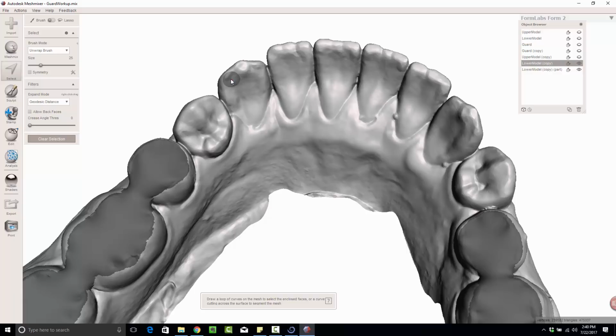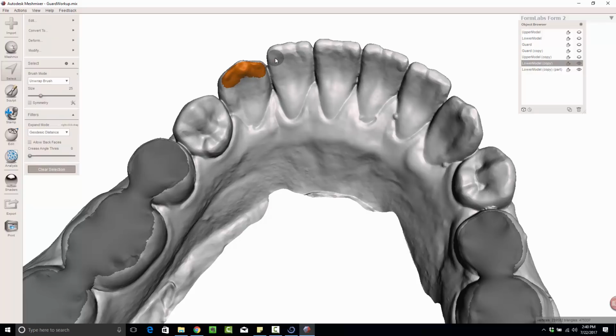It doesn't really matter. We're going to stay to the lingual. We do not want to overlap onto the facial of these teeth. You can go as deep as you want in the lingual. I don't go real deep. I try to stay just at the incisal edge, but it's not going to matter if you go a little bit deep, at least not if they have an overjet like this patient. We want to get the incisal edge and just slightly over top to the lingual aspect.